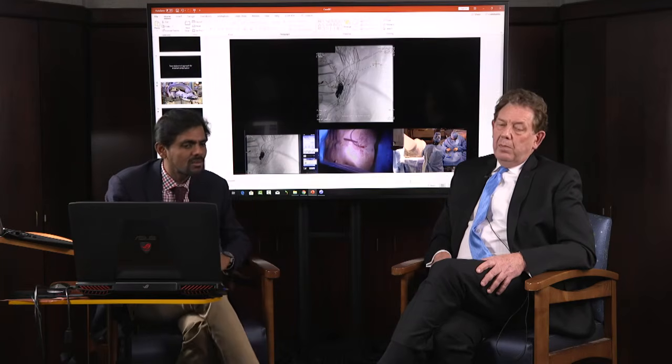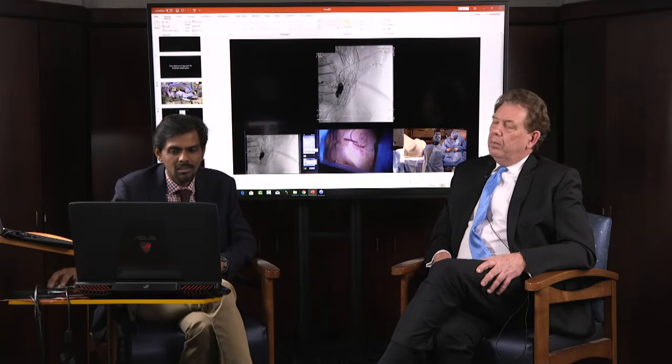Any other questions? Yeah, that's what I was going to ask. What do you do with the later images to be able to see? Well, not very easily. I'm going to put that to Ponraj. Yeah, that is a known limitation with CT imaging, but there have been cases, even one of our cases. This is an illustrative case. So for example, if you see the image, this is a patient who had previous embolization, and we still are able to figure out, this is a different case that I'm showing just to illustrate this point of dynamic imaging.